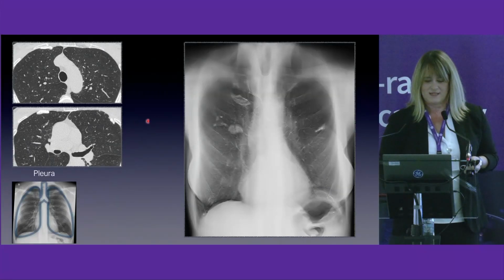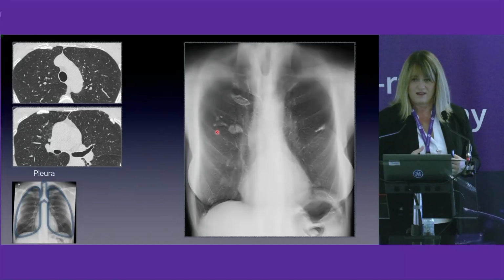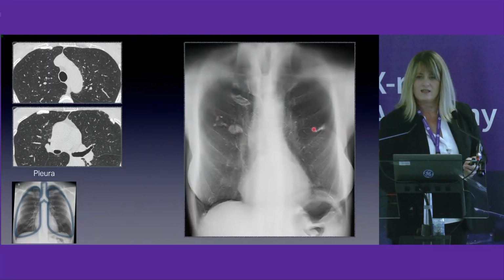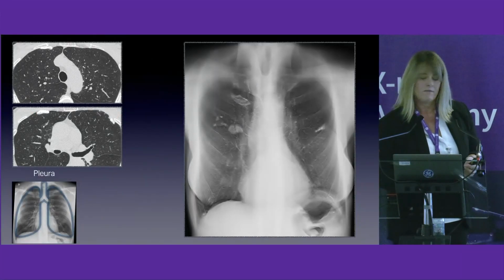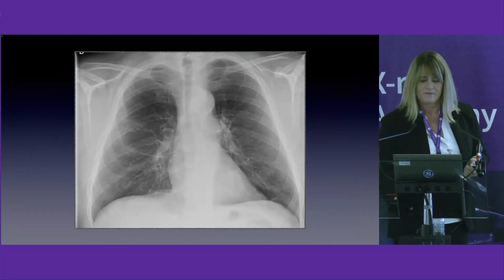This is one selected plane from DTS, and as you can see, just beneath the costal wall, the thoracic cage, we see all of this calcified pleural plaque, as you can see here on axial CT scan. But no nodules were found on chest digital tomosynthesis, so it can be quite useful even for those cases.